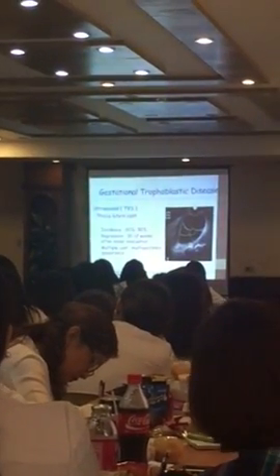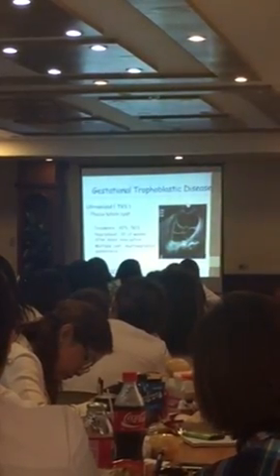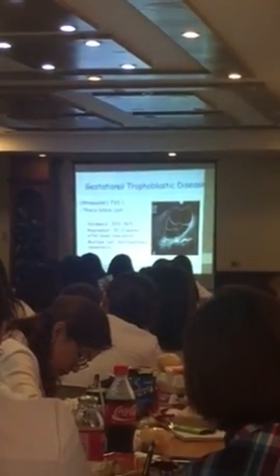So the presence of theca lutein cyst, if seen with a positive pregnancy test, and they will be asking you what kind of cyst, if the picture looks like this, it is very far from your PCO. Okay? With your PCO. So meaning theca lutein cyst.